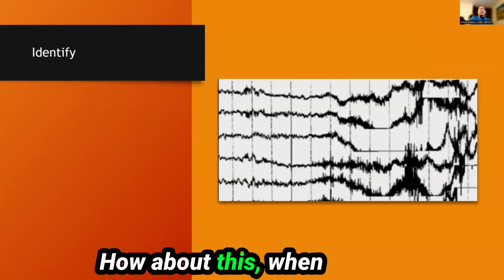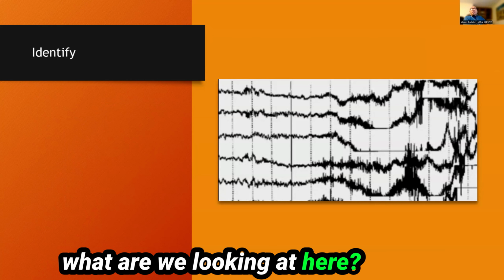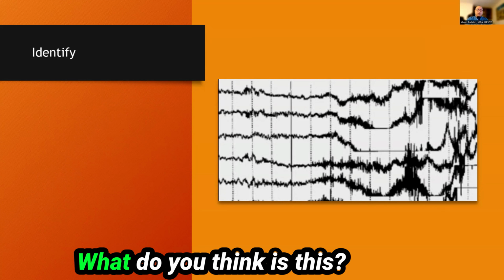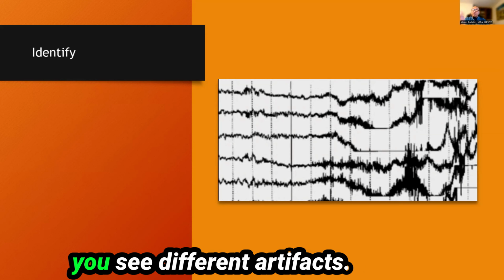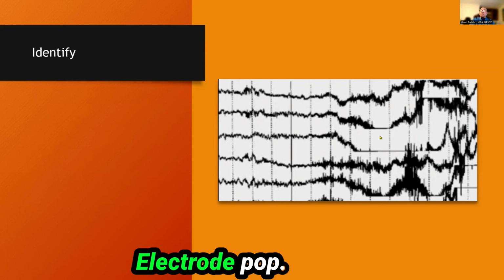How about this? When you see this in your PSG, what are we looking at here? Muscle artifact. Yes. Anybody else? What do you think is this? You said multiple artifacts. You could have bruxism and it can look like this because you see different artifacts. Muscle artifacts here, electrode pop.